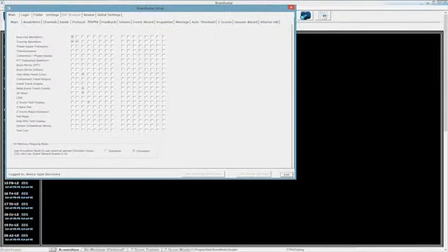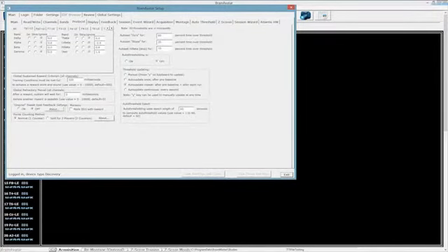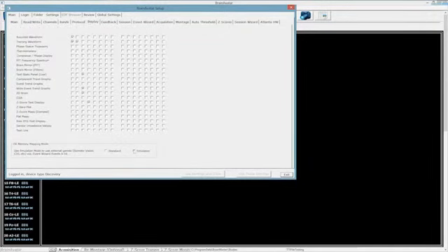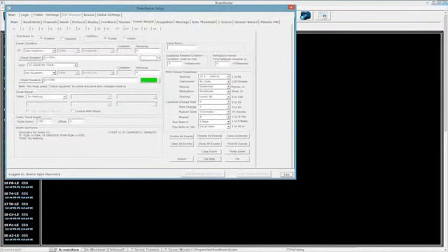And how it's done is right here in this area. DLL memory mapping mode. Standard is going to be your standard protocols right here: go, stop, ignore, reward, inhibit, delta, theta, alpha. Emulation mode, on the other hand, what we have done is we have converted events 9 through 16 to become, and I'm putting little quotation marks around it, "bands."